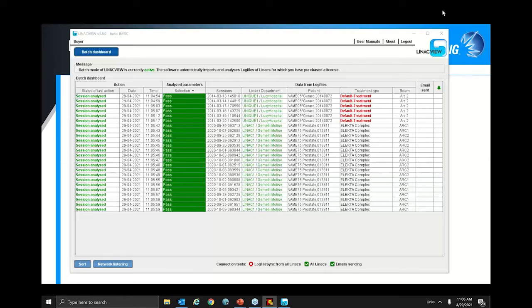And what you notice, if I can get some of my screen cleared, because I have a lot of things blocking my view from the webinar session, is that neither arc shows failures for this plan.